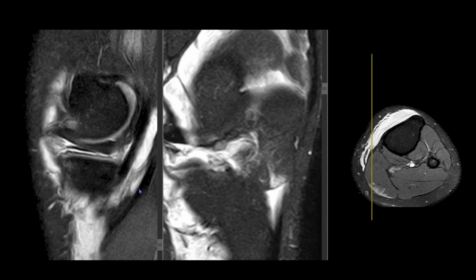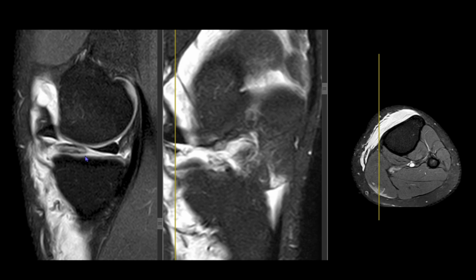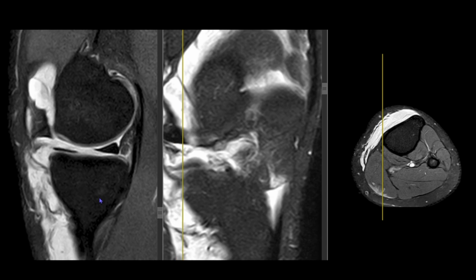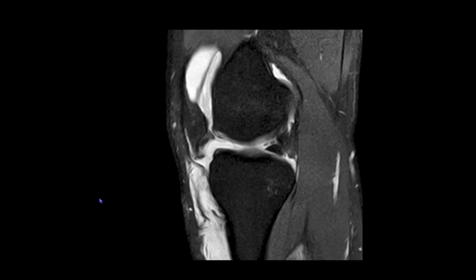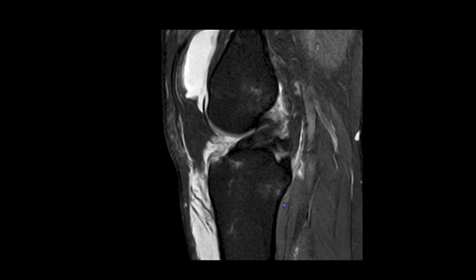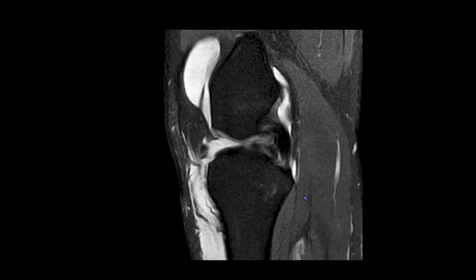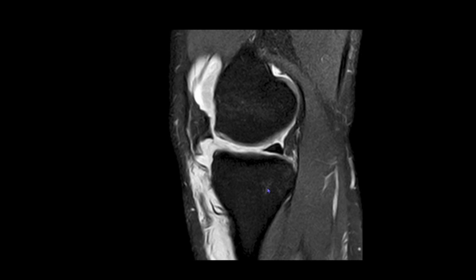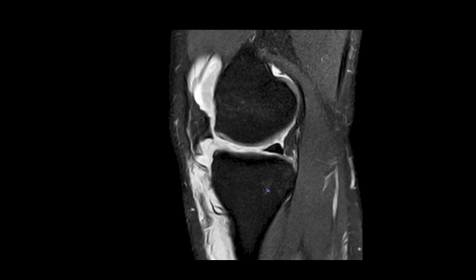We see that there is some widening of the medial joint space, and the anterior aspect of the medial meniscus appears to float freely. This can occur only if there is a tear at the root attachment. So this is a tear of the root attachment, an avulsion, we can say. It's a high grade avulsion of the anterior root of the medial meniscus, which is causing the anterior horn of the medial meniscus to float up entirely. That is the medial meniscus.